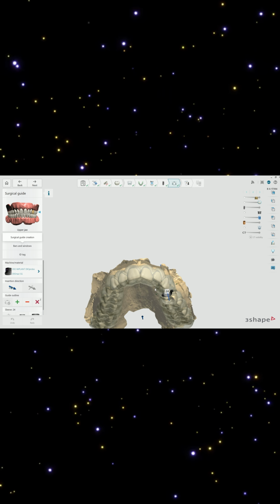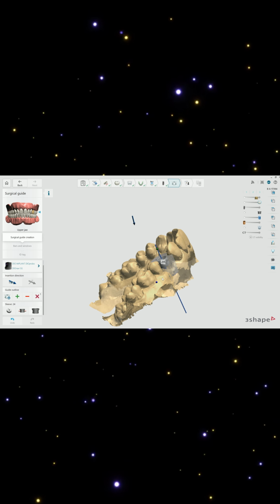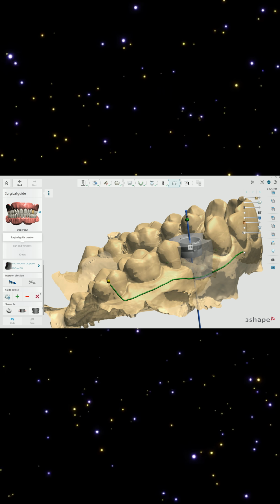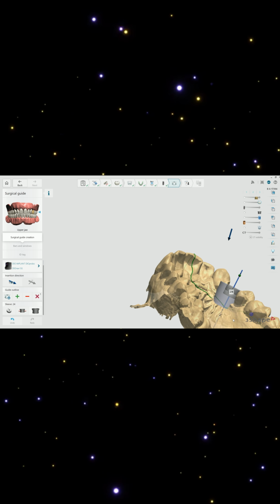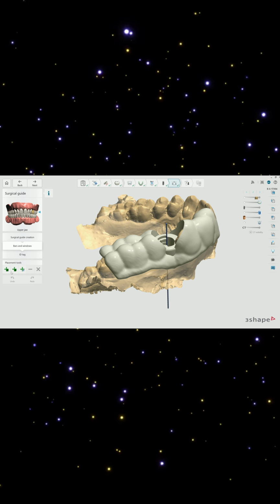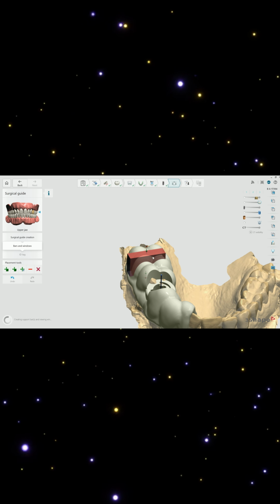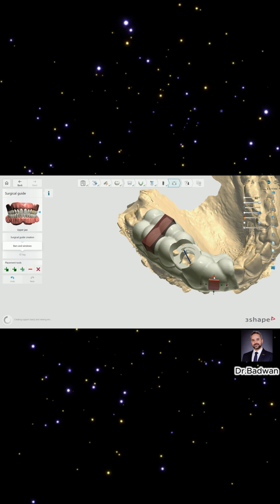The final step is the planning and design of the surgical guide. The surgical guide is very important to make the area accessible for this single tooth. It is enough not to make a very long surgical guide. It is much better to make a small connection of the surgical guide for a small area, which extends from the molar, as you can see, till the lateral area.